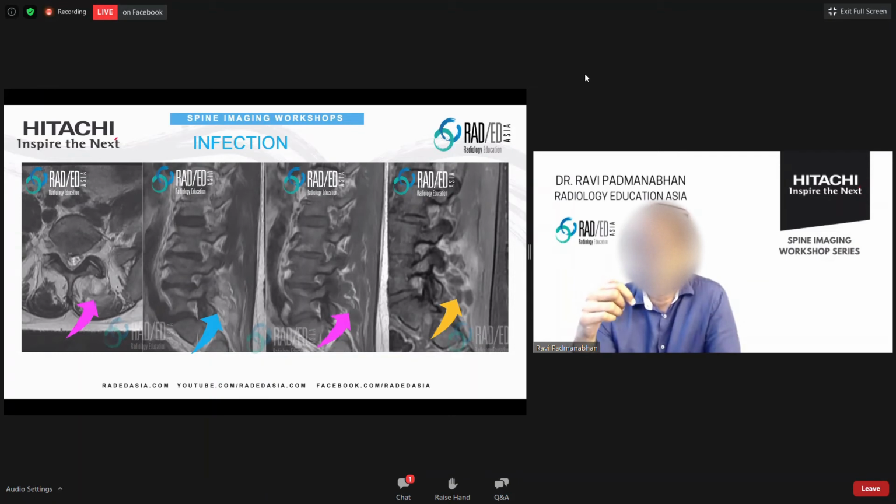Generally, you will see spread of that into the adjacent soft tissue, so you should see some abnormality in soft tissue. So this person had a facet joint infection and developed multiple cysts in the paravertebral region, which is what we see here. It's uncommon for just the facet cyst to get infected. There's usually an underlying facet joint infection.